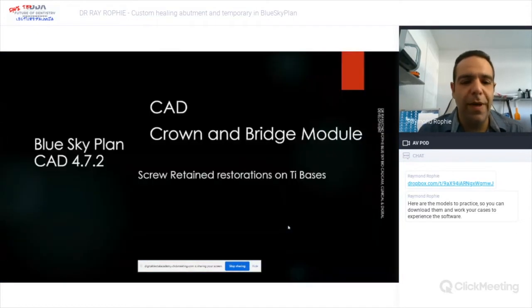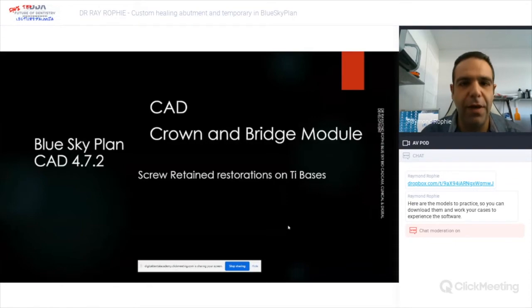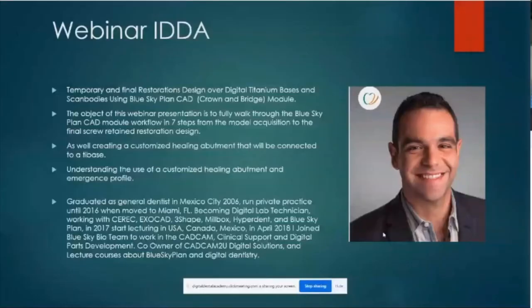Okay, so basically we're going to be talking about the new release of the software, the 4.7.2. Now it's available either in Mac or in PC. I work in PC, but you can do it in the Apple as well.